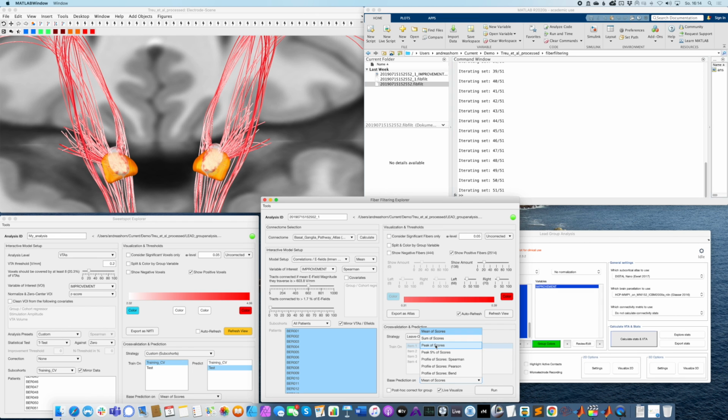How much will the peak E field modulate, and so on. And then these are even more complicated. That is basically the profile, so the spatial correlation across the E field shape and the landscape of the model shape. And this shows that, again, the way of how to do predictions can be done in various ways. There's probably not one single optimal strategy for this.